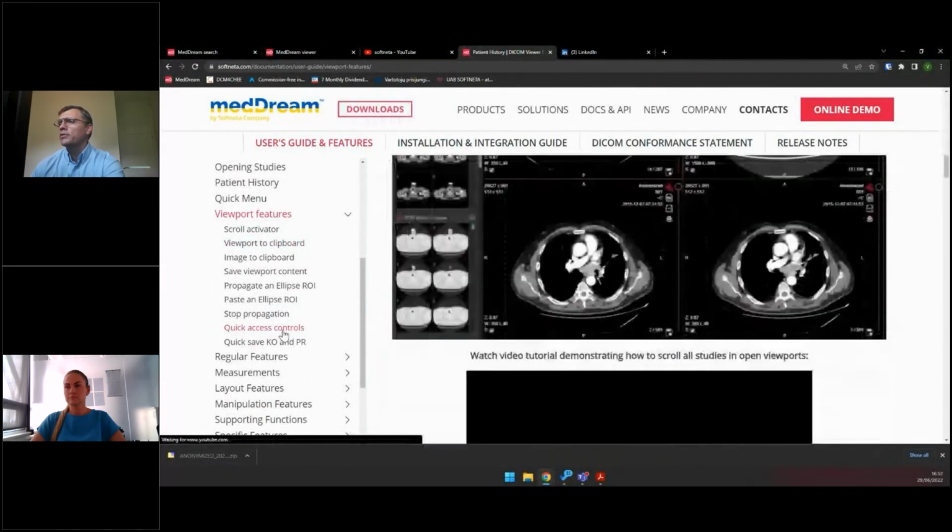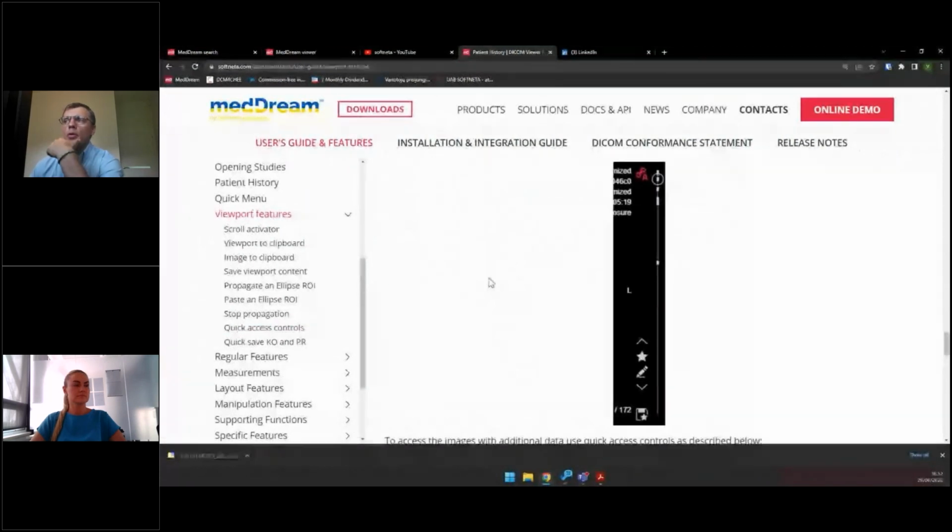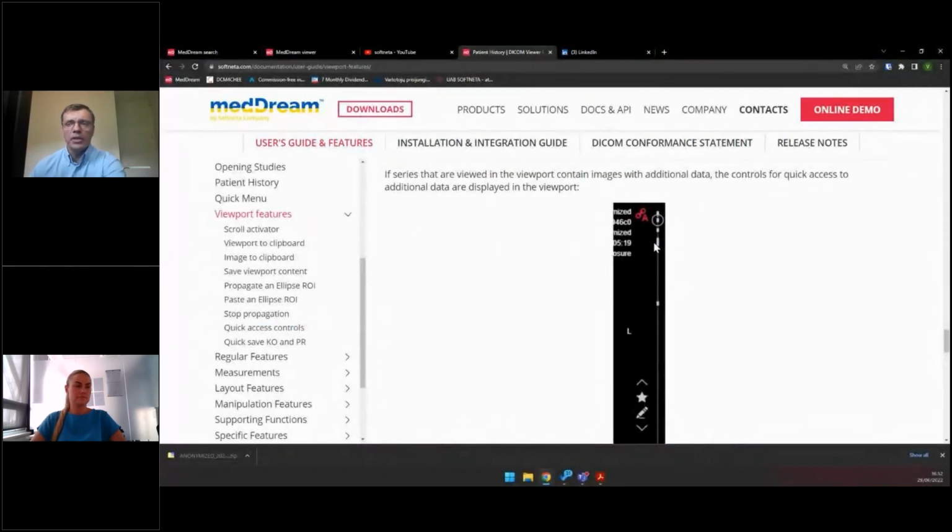This is the most important. If you are searching for something and you don't know where it is, you can go through this tutorial and get explanations.